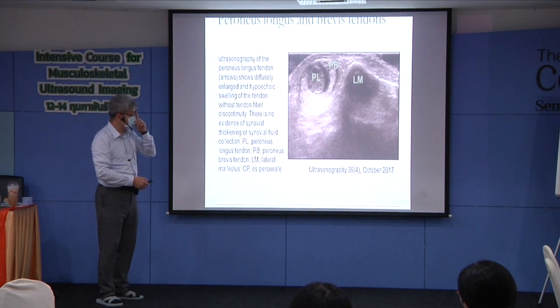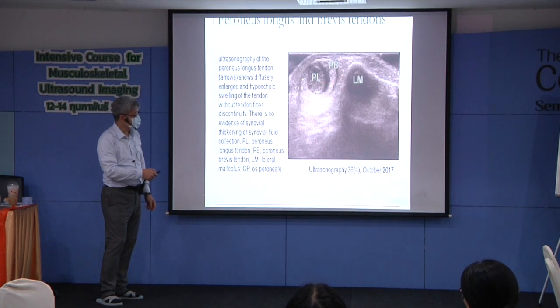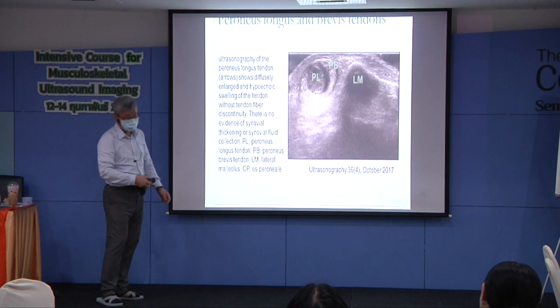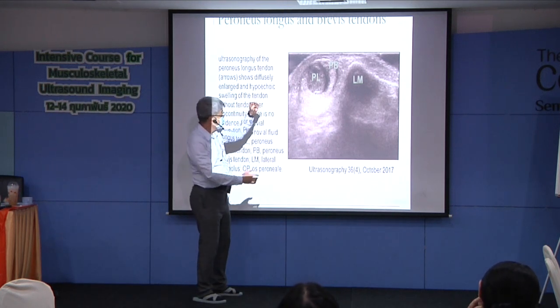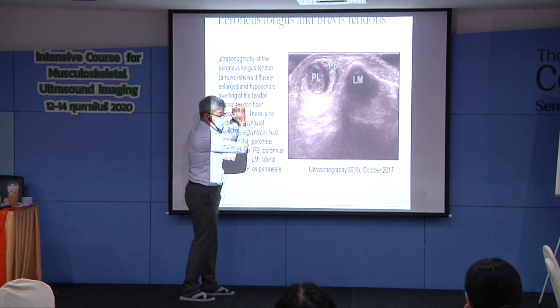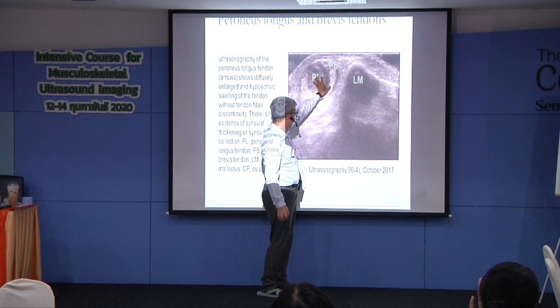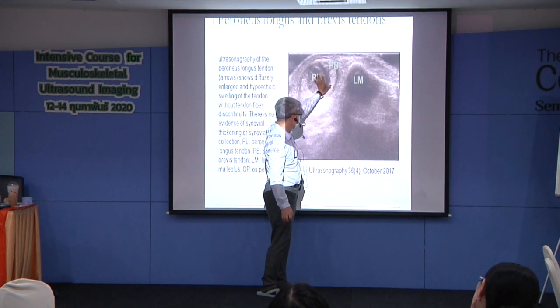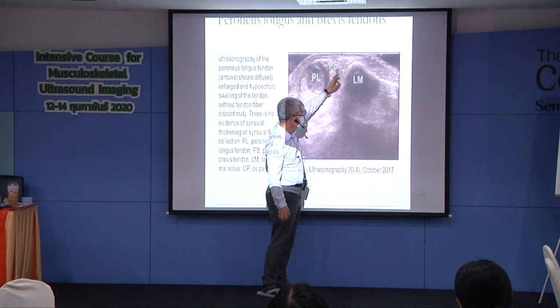As I mentioned in the morning, when we get close to the lateral malleolus, the peroneus brevis takes the place of the longus. The peroneus longus is round in shape, and the brevis is like a new moon. During dorsiflexion, the longus rotates clockwise and moves anteriorly.